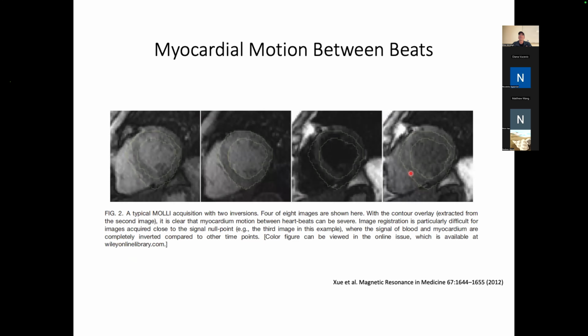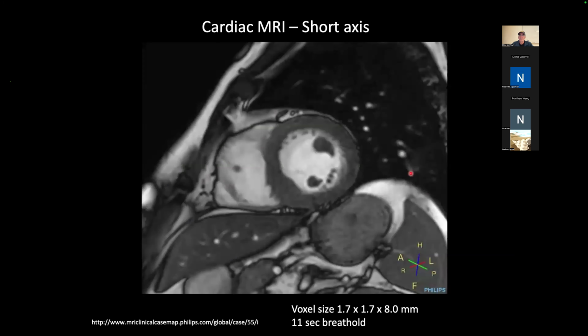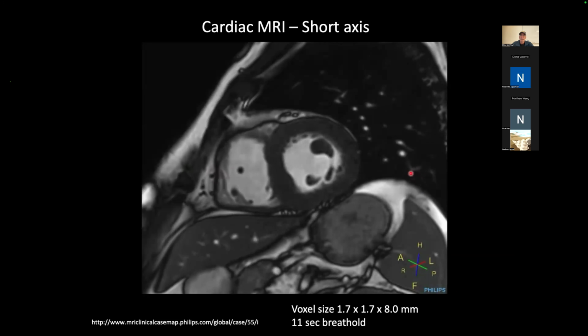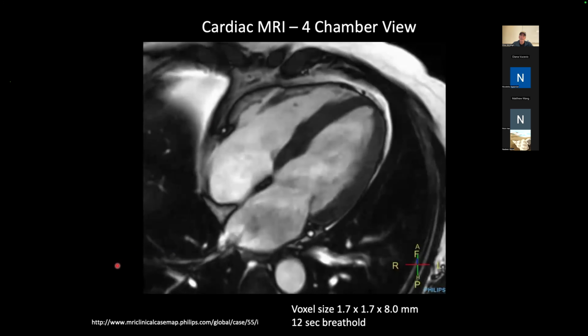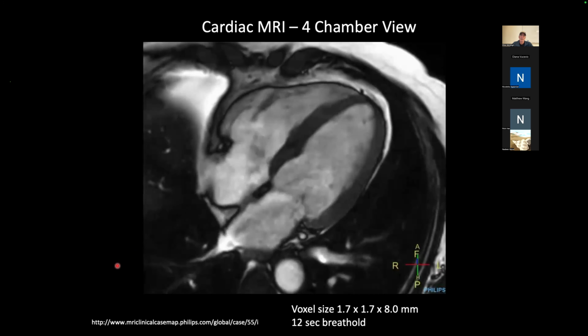You really ideally would like to do this stuff in 3D and then do a 3D re-registration of all this stuff. As we've seen before, if you hold your breath, you get these amazing movies of, let me show why it's not.